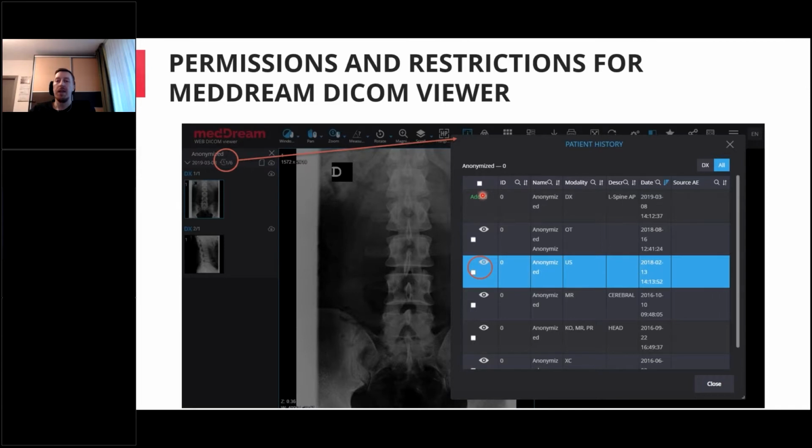So this is quite an important thing to check, and the same goes for all the other permissions, of which there are a lot, and all of them are explained in the installation manual, including what these permissions and roles do.